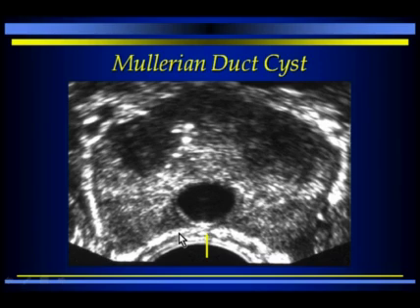The significance really is to recognize that this is a benign process, and unless the Mullerian duct cyst is causing symptoms, if it's infected or if it's obstructing the ejaculatory ducts, there's no reason to treat it, just let it be.